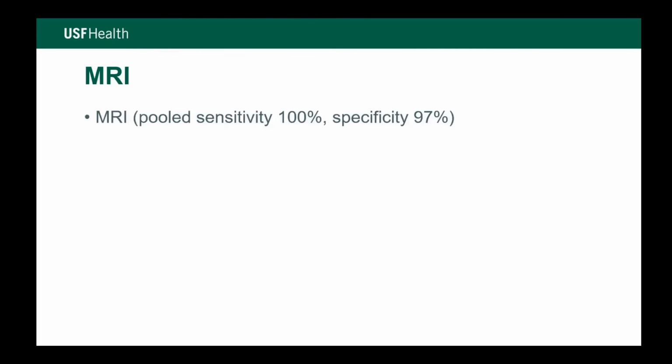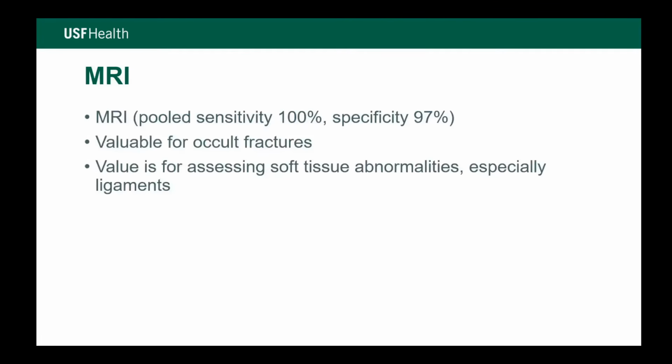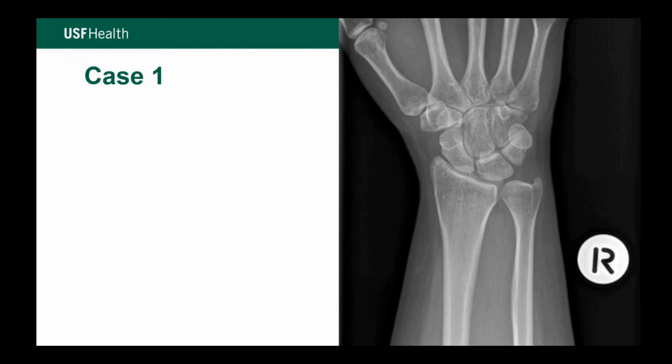MRI is also extraordinarily useful, but generally unavailable in the emergency department. It also looks at soft tissue lesions, which is why it's probably more useful in the outpatient setting, not generally available in the ED. So this is our first case.